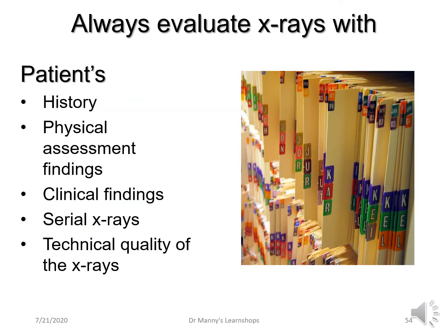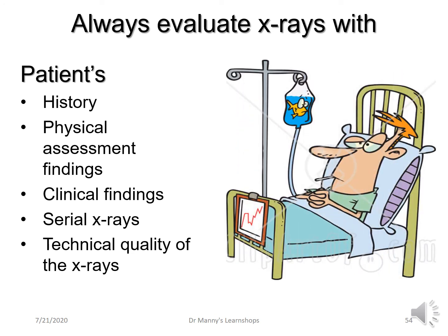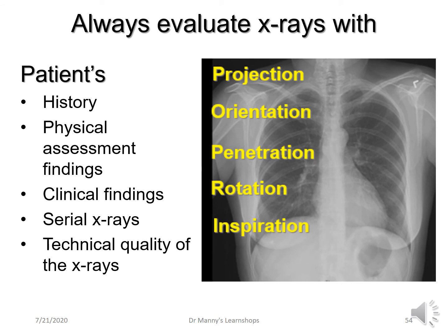Remember to always evaluate the chest X-rays with the patient's history, their physical assessment findings, what they're like clinically. If possible, which may not be possible, look at serial chest X-rays to give you an idea of where the changes may have occurred. And then review the technical quality: projection, orientation, penetration, rotation, inspiration, and then you can look at the chest X-ray.